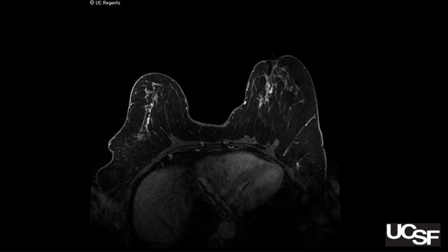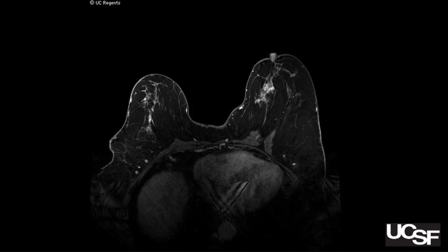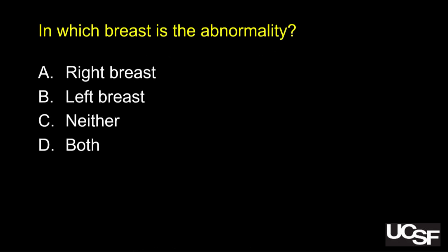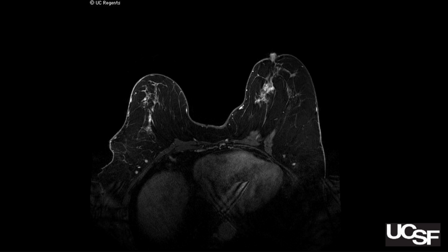So you just read it. Here it is, a couple more slices. Okay. So again, a lot going on. And you kind of just read through the positioning issues. So nothing, she's never had surgery, just the breasts were not positioned symmetrically. Okay, so right breast, left breast, neither or both. I'm going to go back through so you guys can think to yourself now that you know what the question is. It's the usual question. You're reading an MR and you're like, okay, is this BI-RADS 6 next case, or is there something else that I need to do? Is there unfinished business?